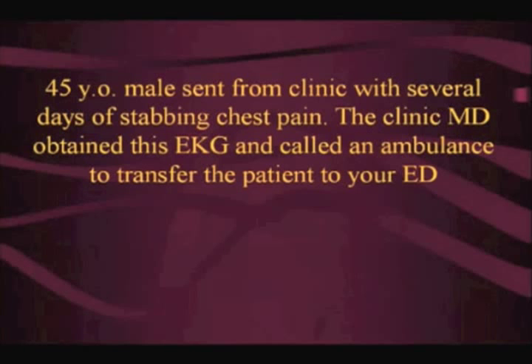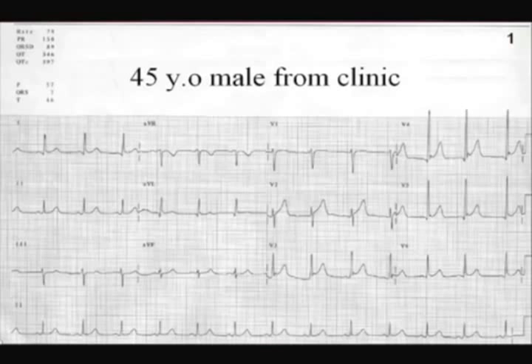So a 45-year-old male is sent from clinic with several days of stabbing chest pain. This is an EKG I got. Clinic MD obtained the EKG and called the ambulance to transfer the patient to your ED. And then this is the EKG. So what do you guys think?